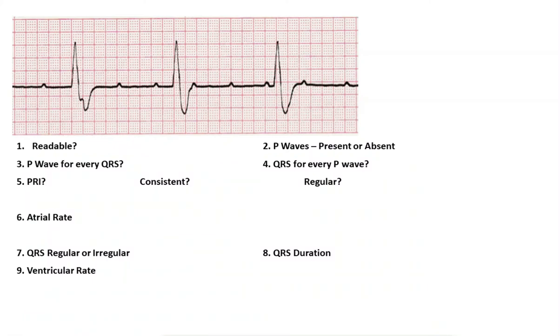Hey folks, here we are talking about a third degree heart block. That's right, one of the things that most people hate dealing with, and that is trying to identify a complete heart block. So we're going to follow through the rules and the definitions here, and hopefully at the end of this, you're going to have a better idea of what it is that we're looking for.